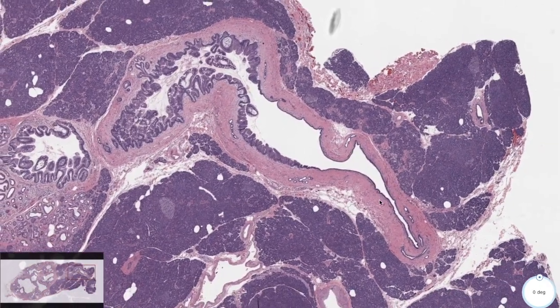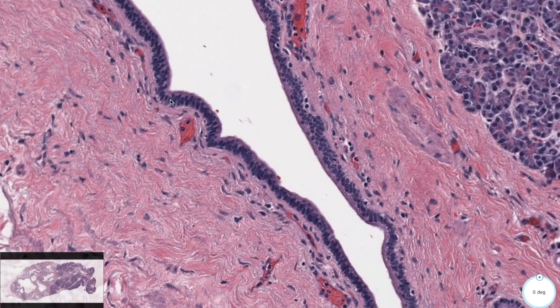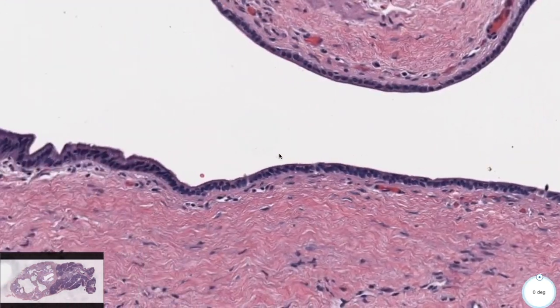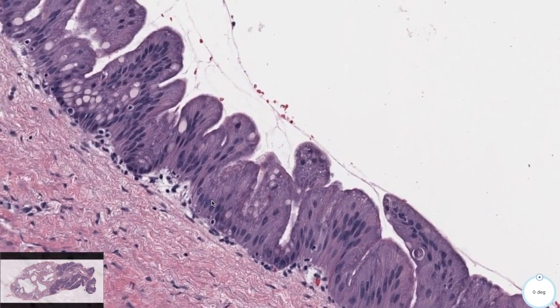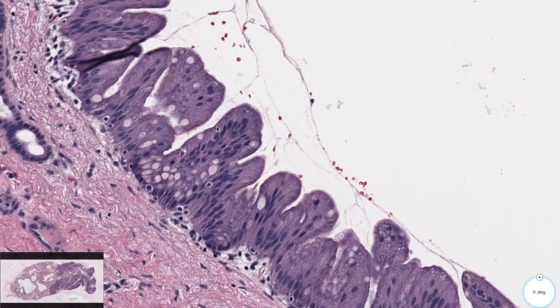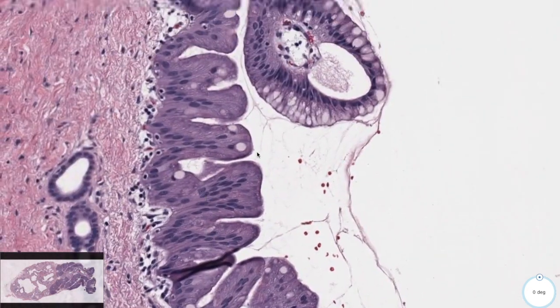And the reason this is also a beautiful section is because right over here, we could see what normal pancreatic duct epithelium looks like. But then, let's keep tracing this epithelium, and look at it right over here. We are seeing loss of polarity. Look at that, loss of polarity, some tufting, some papillary-like structures. We're also seeing these goblet-like cells over here. That is very suspicious.